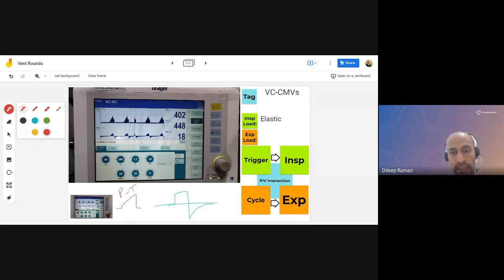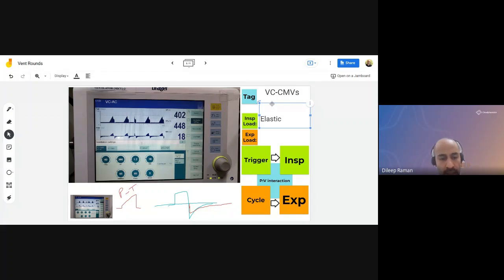What we are seeing is the patient's breath is coming and it's actually staying and then reaching the baseline very late in this part. These sections of the waveform, we are actually seeing that. So potentially, Mani Balaji's comment is that maybe this is an obstructive problem, and that's possible. We can label it as such and mark it as obstructive as well in the expiratory load.